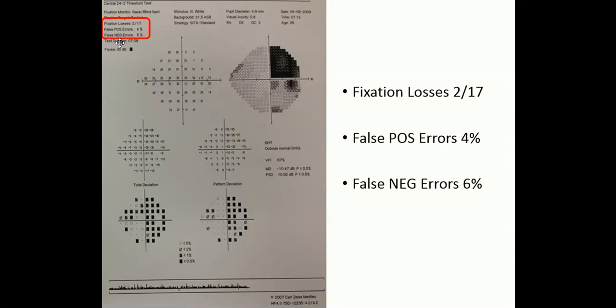What the machine does is that at the beginning of the test, it very quickly checks, while the patient's hopefully still interested and engaged, a couple of points, and determines very carefully what the sensitivity to light is at that point. Let's say, for example, over here in our plot, that at this point here it tests and says, okay, the patient has a 27 sensitivity to light, which is pretty good. What it then does is, during the test, it comes back and shows every so often a light in that area that's even stronger than what the patient's threshold was. So it should be easy for the patient to see it. And it looks to see how many times the patient clicks that they see it. Of course, if they had seen it 30 seconds ago, then they should see it 30 seconds later.